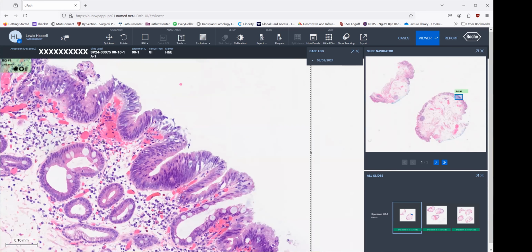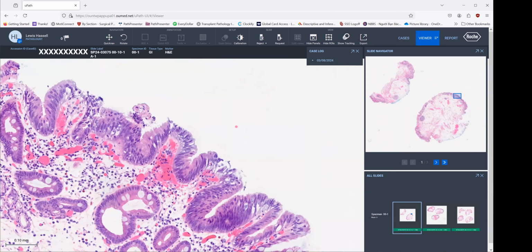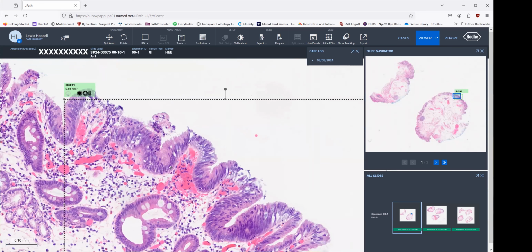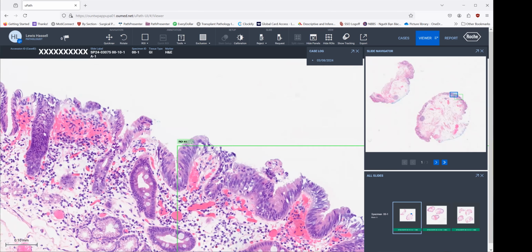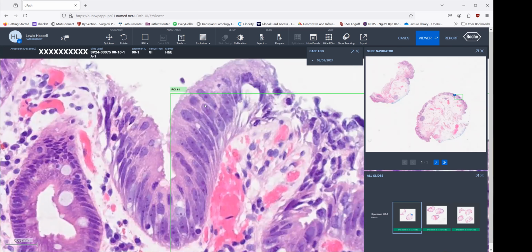It's at the surface, which is one of the criteria that we use for detecting dysplasia in these patients. And it's more than just a single gland. It goes clear over to here, maybe even a little bit farther. And we don't have any active inflammation. But here you can again see increased size of the nuclei, the beginnings of nucleoli, a little bit of loss of polarity, but certainly increased size compared to a more normal metaplastic gland here next to it. We'll look at a couple of the other sections as well.